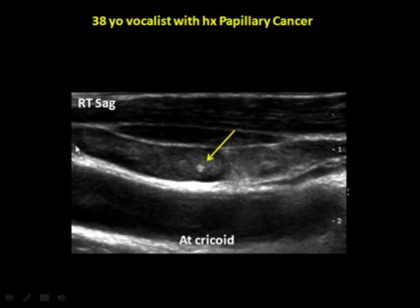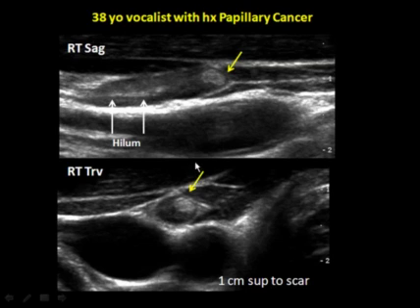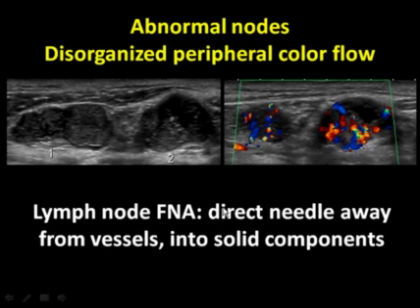And again, an elongated node with abnormal echogenicity and a focus of microcalcification. Again, same patient. You can see portions of the hilum and then this echogenic focus at one pole of this elongated node. Again, echogenic focus within an abnormal jugular chain node.